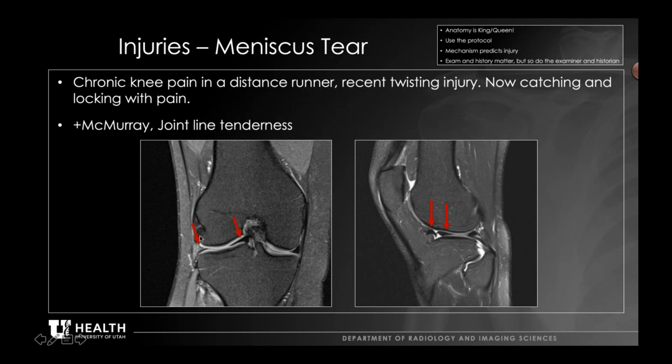That thing. So this is actually called the popliteal fossa. So what tendon do you think lives there?